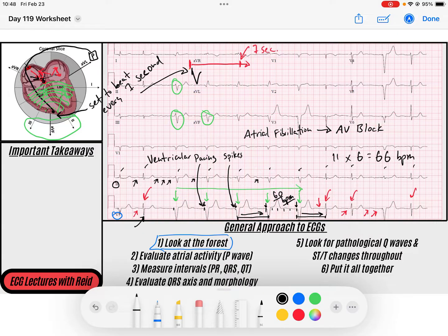And so now we're waiting, and we're at this flat line, baseline, baseline, baseline. That ventricular lead is waiting, and if we get to that 1 second mark and we haven't had a beat that conducted through the AV node down to the ventricles, we get a pacing spike and we get a QRS, and then we go back to waiting, right? And so then we reset the clock for another 1 second, right?